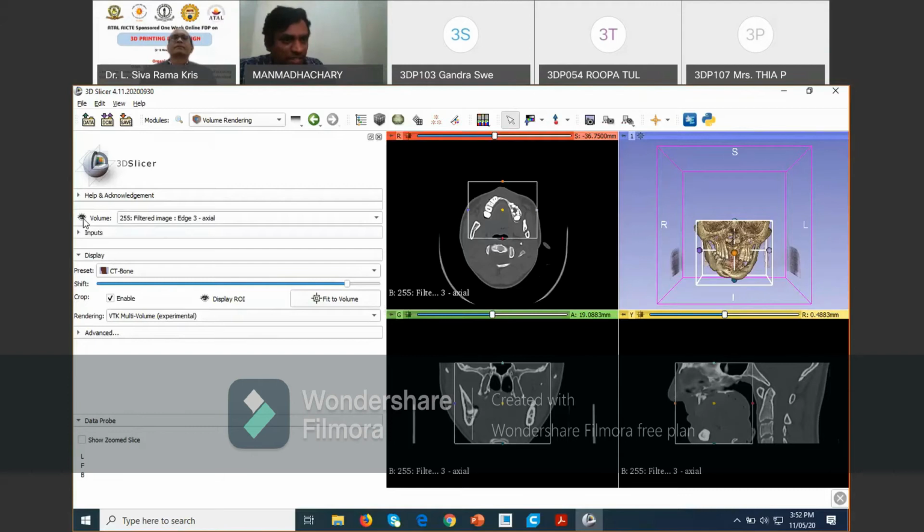Then go for the volume here. There is an eye symbol, madam. Just click on it. Yes, I have clicked it. Then go for the crop. Click it on enable. Crop, enable. Go for the display ROI. There also you have to click it. Yes, sir.